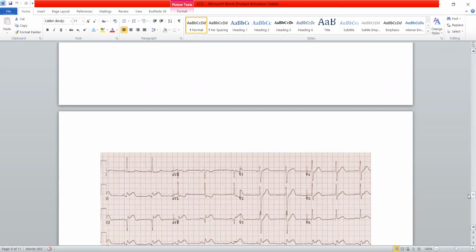2, 3, aVF. What are the abnormalities in 2, 3, aVF? ST elevation, excellent. Are there any other changes in this ECG in any lead? Asaf, you were asking about the normal chest leads on an ECG. On this side of the ECG, all these waves are normal.